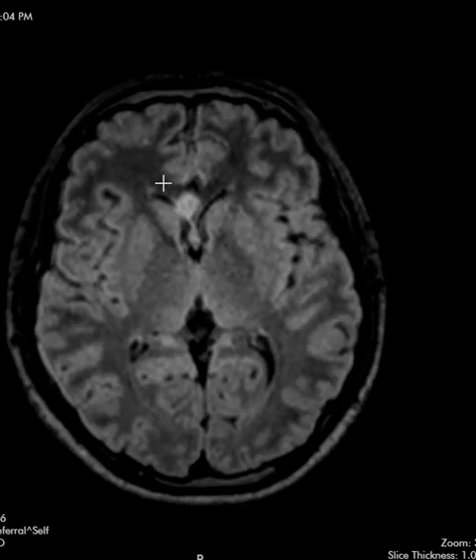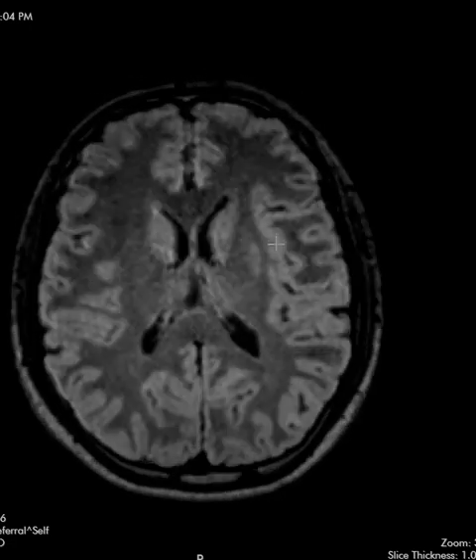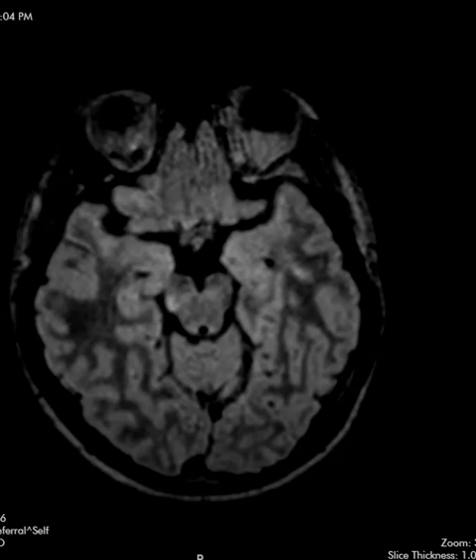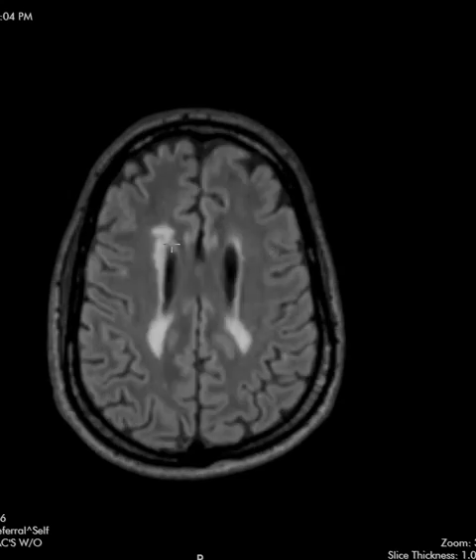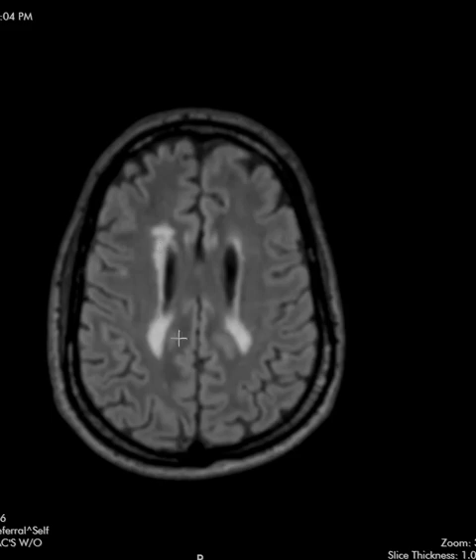So this is that anterior corpus callosum affected, and this is a rounded area. It looks like a tumefactive MS plaque. Looks almost like a tumor. And the posterior corpus callosum back here looks good. So another case of MS affecting the anterior corpus callosum, and down here in the midbrain on the right hand side, that little lesion right there. And this is a patient who has known MS, little horizontal lesion here. We see this hyperintense signal surrounding the ventricles, the pericallosal or periventricular white matter. So this patient has MS that's hugging the ventricles here.